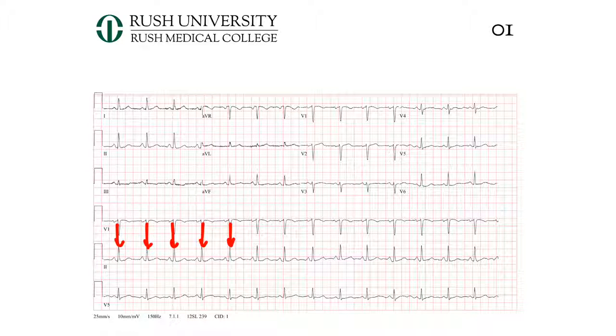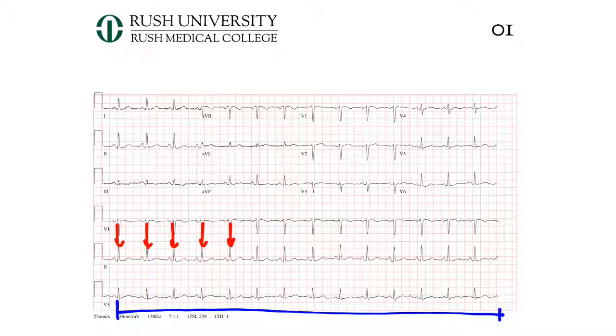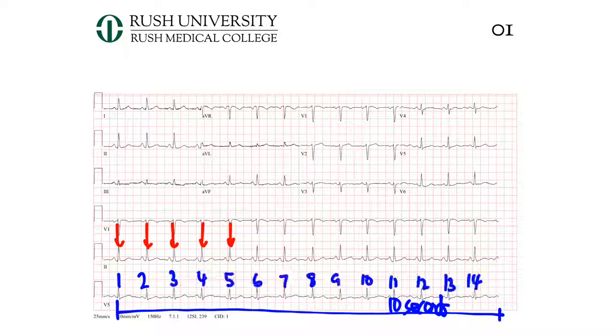The first way is to know that the EKG from one side to the other is about 10 seconds long, so you just count how many beats there are in 10 seconds, and since there are 60 seconds in a minute, we multiply that times 6. So here we have 14, right? 14 times 6 is 84 beats per minute.